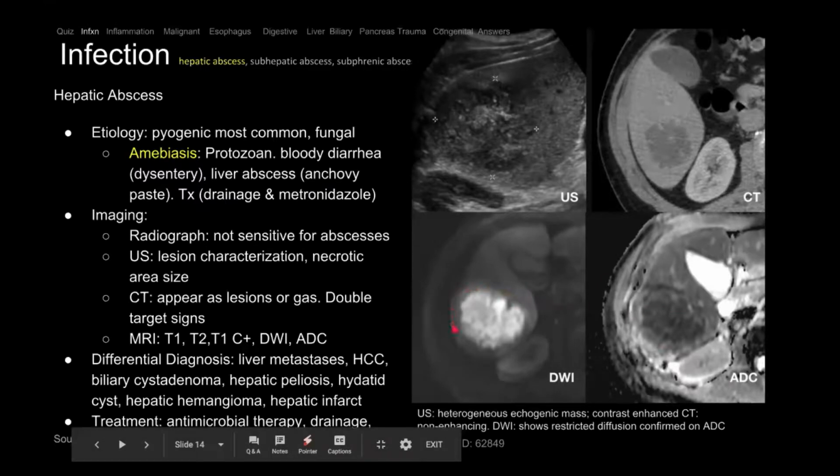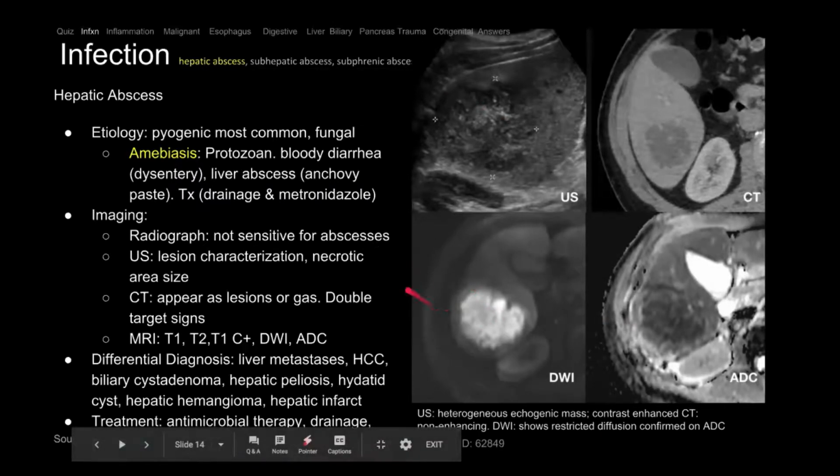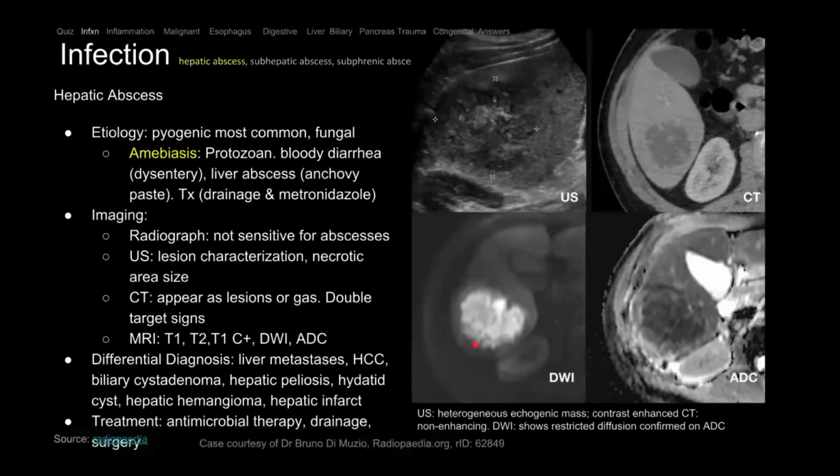It has a thick wall here, if you can see. And the wall, the phase is a little off, but it's enhancing. And it's not a simple fluid like water. It's a complex, thick, viscous abscess, okay? So typically for abscesses, the rule of thumb is 3 centimeters. If it's greater than 3 centimeters, it needs to be drained percutaneously. So the interventional radiologist just puts a wire and a pigtail catheter in here. If it's less than 3 centimeters, then you can try a trial of antibiotics, and then see if that will work.